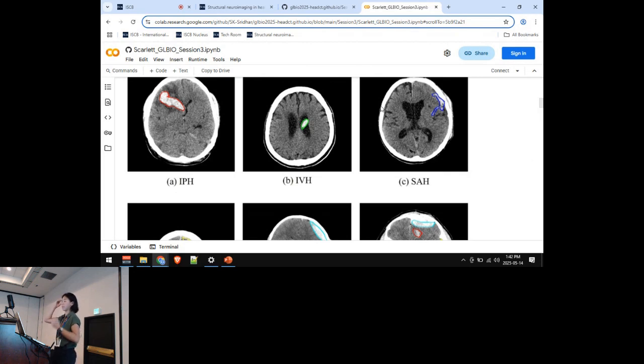Same with the brain, but because sometimes the brain has way more blood, we have to drain it out. But if you wait, your body tends to digest and reabsorb it. That's why the longer you wait, the more the blood looks like the tissue in your brain, and then eventually it goes away. So a very bright color means it's a very recent incident that caused it.